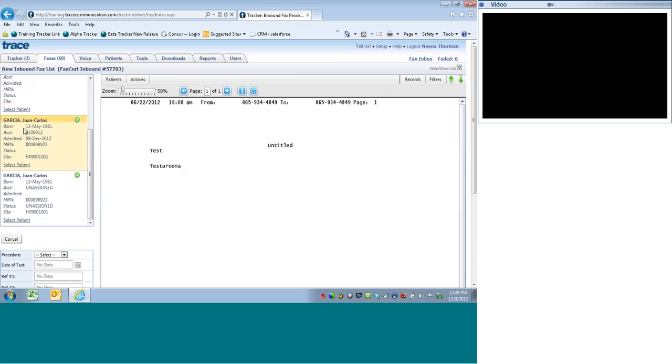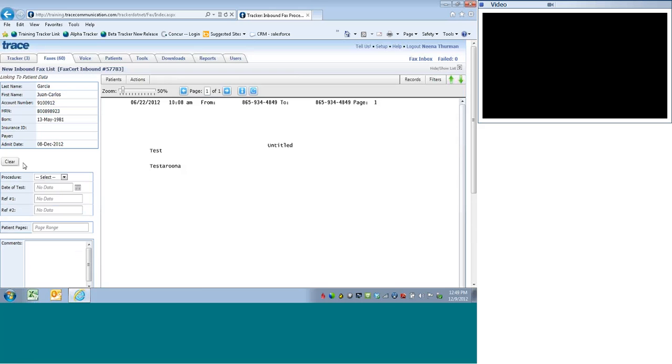And you'll see here on this particular record, date of birth May 13th, 1981. We have an account number, an admit date, and a medical record number, as well as a site number. A site number applies to your specific facility if you're in a hospital-wide system that has many sites and locations. If this is the particular patient and the admit date coincides with the order or the fax, you can simply select the patient and it will automatically populate.